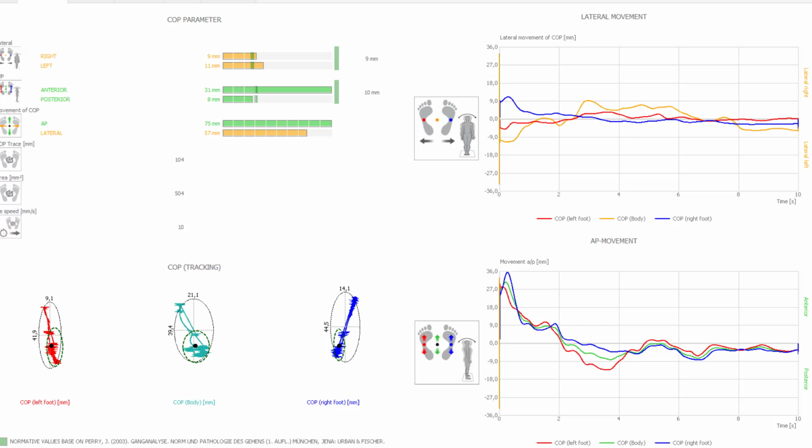So what are these graphs about? On the one hand, it can be recognized here whether certain maximum deviations result from a repeatable fluctuation behavior or only represent one-time outliers.